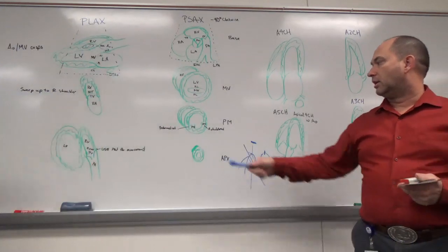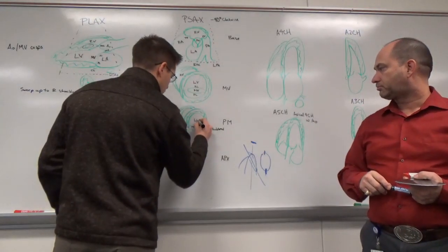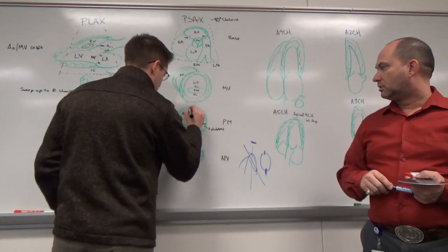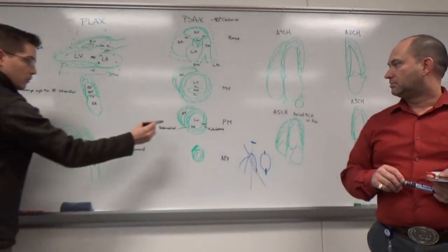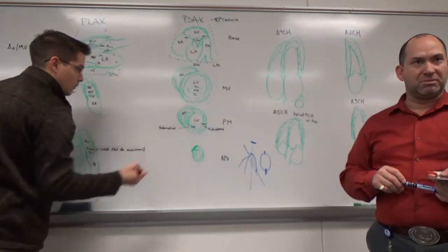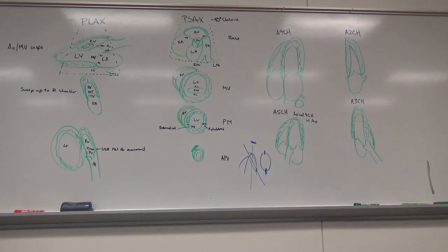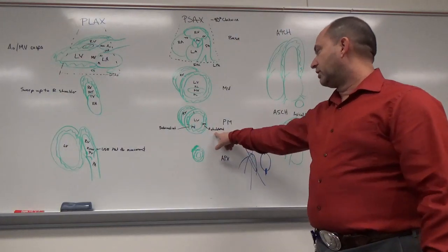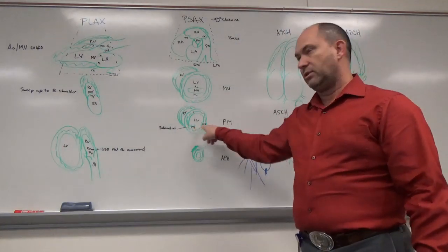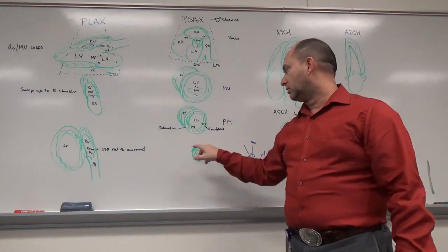Good. And then chamber is LV, good. And RV, good. Where's the septum? Interventricular septum on that. It should seem obvious, but it's in there, okay? So right now I'm just going to be pointing out the septum because those are landmarks that help us distinguish what we're looking at. If I took this view and totally twisted it, this is called the anterolateral, and yet I drew them kind of equally at the bottom of the image. Why is that? This is posteromedial.